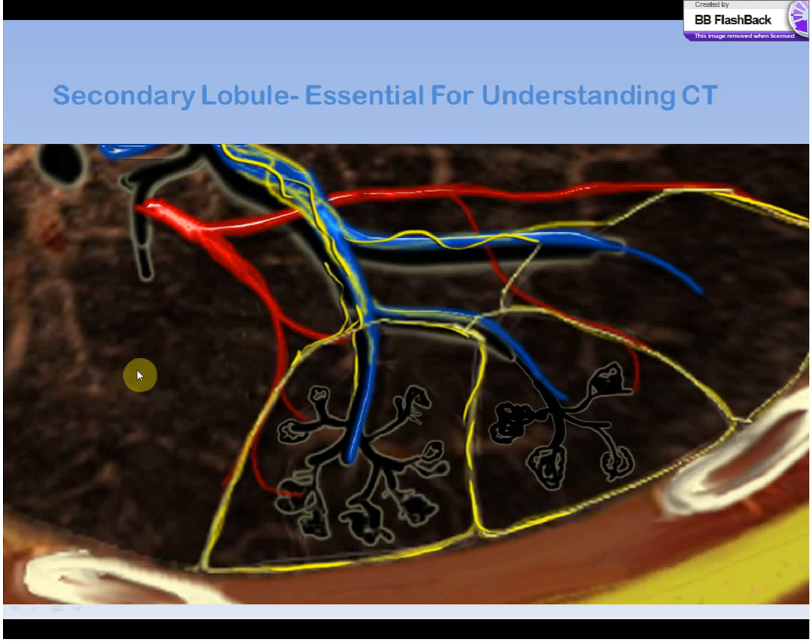So just to go over this, this is the pleural lining here. This is the lung parenchyma, and you're following a large airway into a smaller airway all the way down here, and along with it comes the blue pulmonary artery, deoxygenated blood in this circumstance, and the pulmonary vein, which would be coming from the alveoli out back to the left atrium through the pulmonary veins. Outlining the secondary lobule are the lymphatics and pulmonary veins, right there. And within the secondary lobule is the airway, which then breaks into the terminal bronchioles and into the alveoli down here.